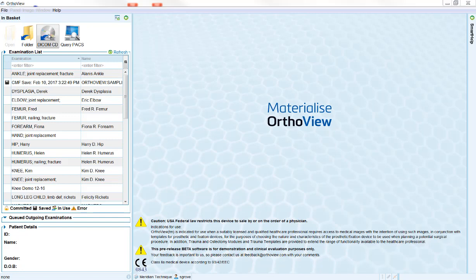Images can also be imported from a DICOM CD and any local or network folder. Images to be imported can either be DICOM files, JPEG, or bitmap files.